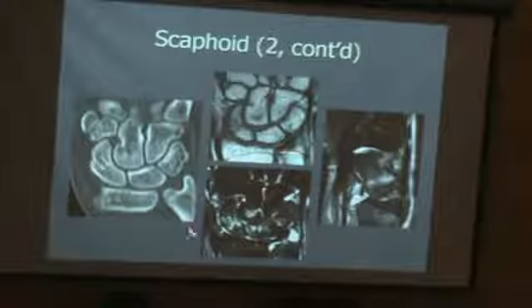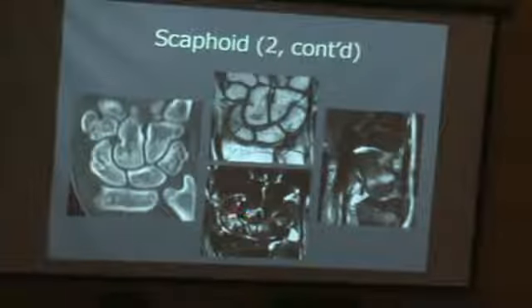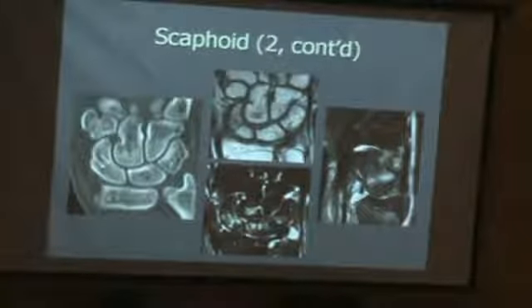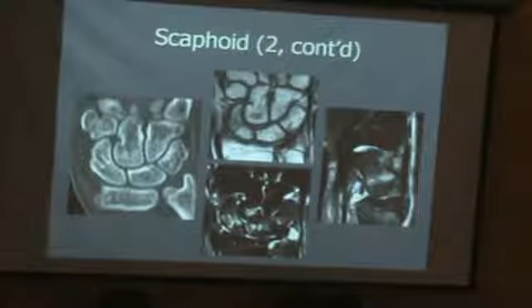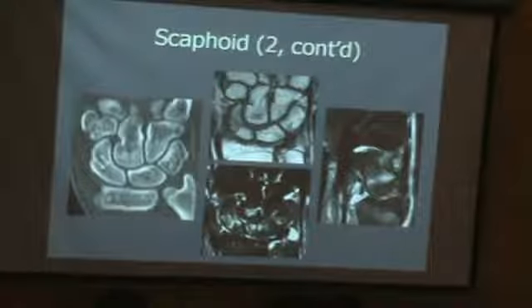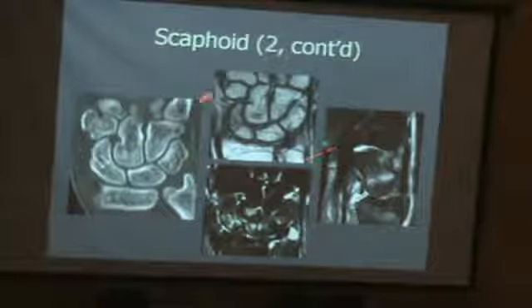Now, if you have time, of course, you can go for a coronal view or sagittal view, and you see very well the fracture line, hypointense, and the hyperintensity of the scaphoid. But if you have no time and you have the opportunity to do an MRI, with one sequence, of course, the T1 weighted, non-fat saturated sequence is really your best friend.